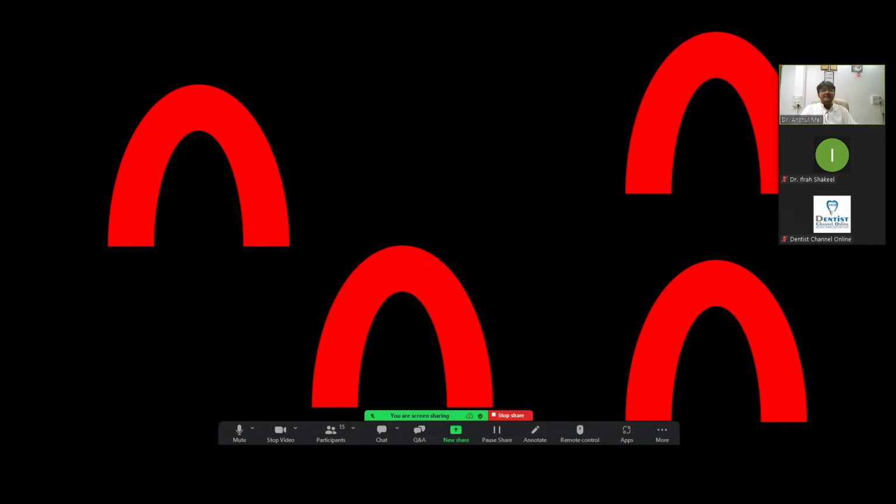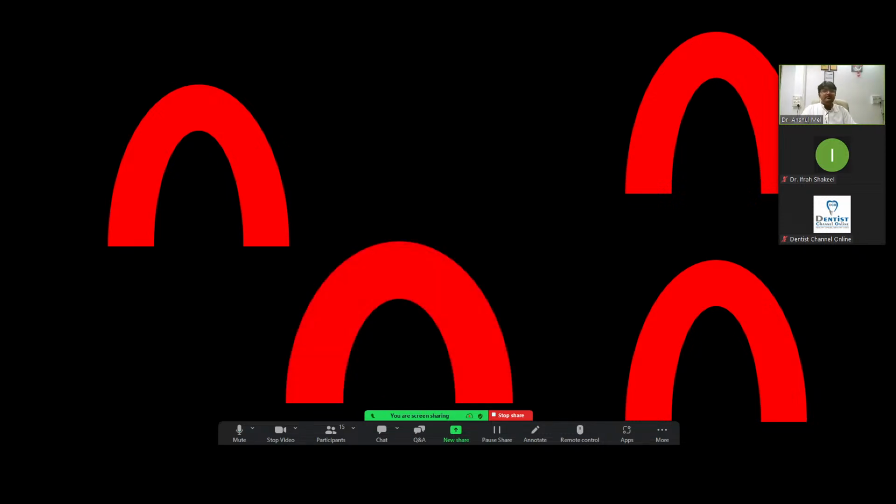The most common problem is that if you have a full arch implant, you will get this same U-kind of jig. It has a flexibility like this, you can see. It will flex if it is a pattern jig. A jig trial is also available in gypsum. If it will not flex, when the doctor is trying to fix the screw, it will fracture because the impression was not perfectly taken.